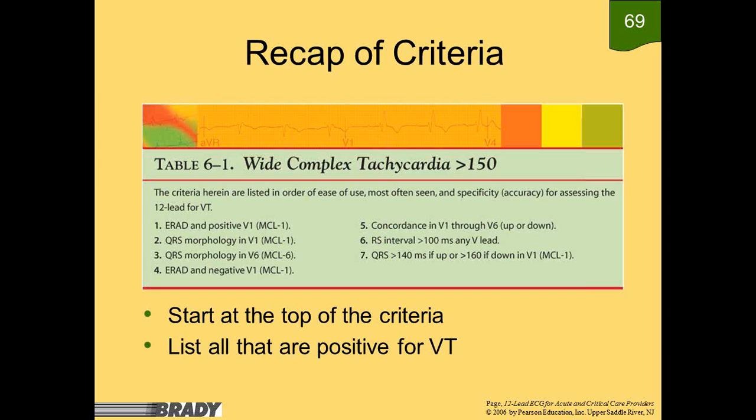The other thing we're going to look for always when we're looking to diagnose a 12 lead is P waves. So if there's P waves there, we want to make sure that they're in all leads. You may see a P wave in one lead, but if you don't see it in any other, then it's not a P wave. So we want to look and make sure that we have them. If we see them out of place or isolated, look in a couple other leads because you want to make sure what you're seeing is really what you're seeing.